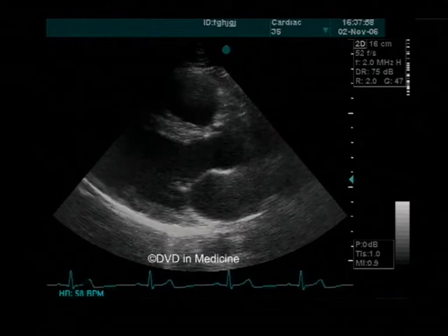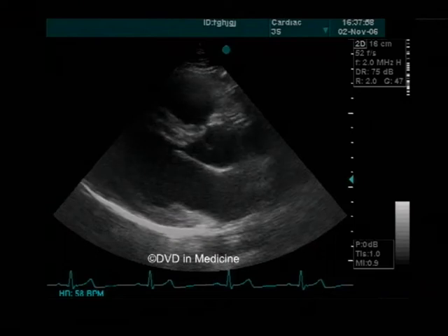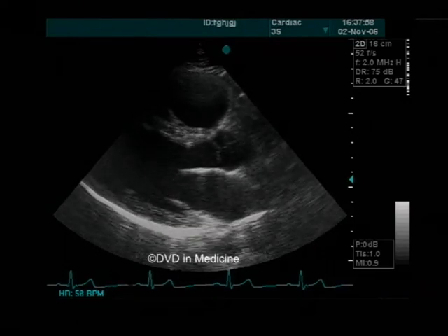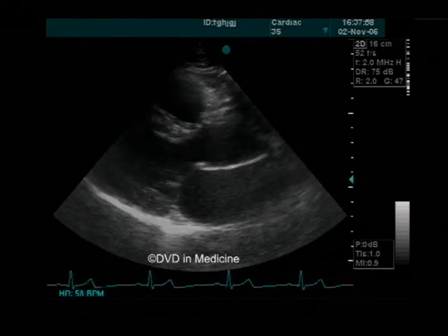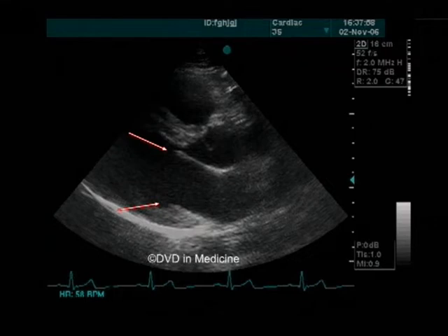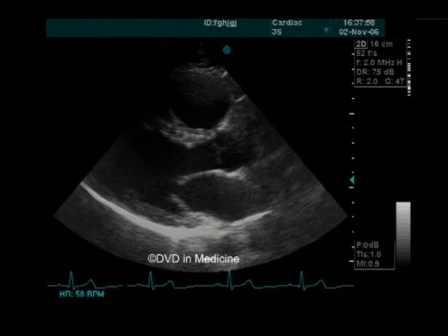During diastole, the mitral valve opens twice, when the patient is in sinus rhythm. At the start of diastole, the left ventricle relaxes and fills up with blood from the left atrium. During this time, the mitral valve leaflets separate and droop into the left ventricular cavity. When the early diastolic period is finished and the left ventricle is filled with blood, the mitral leaflets move in the direction of the left atrium. At this moment, they are partly closed.